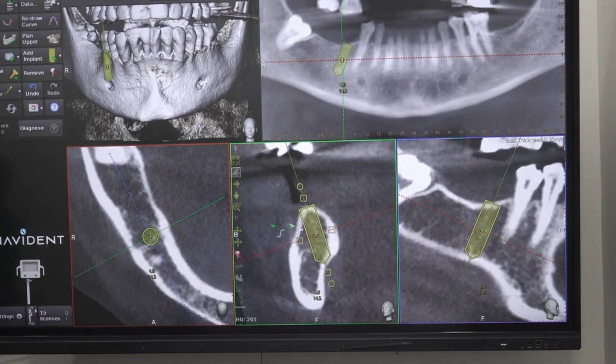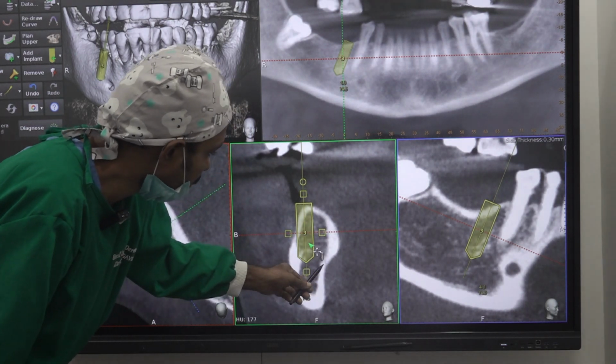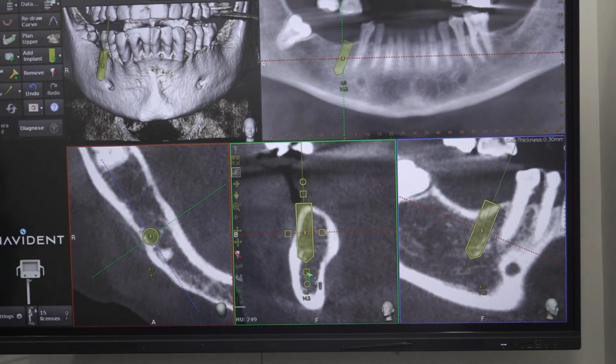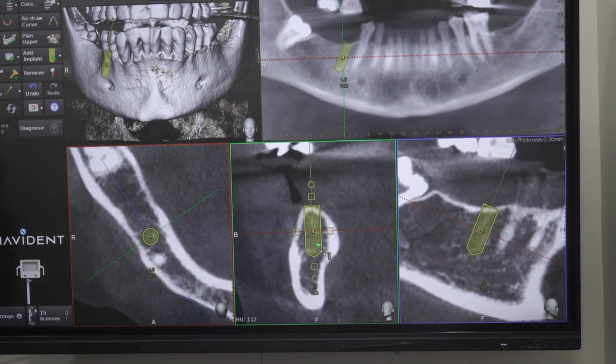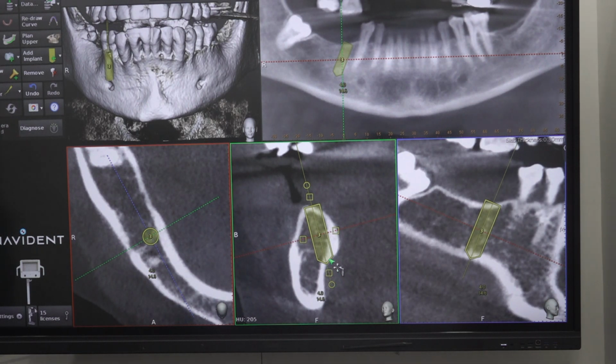First we will finalize the canal, we will find the canal. Mostly this may be the canal. But below this, there is a depression. So even if you are reducing 2 mm, you can place up to 13 mm, but 12 is enough. So 4 into 12 we can place intramedullary, or we can tilt and place a longer implant, getting the lingual cortical. So this is one plan.